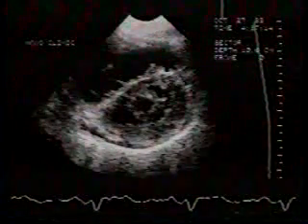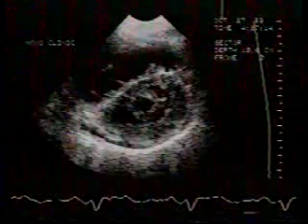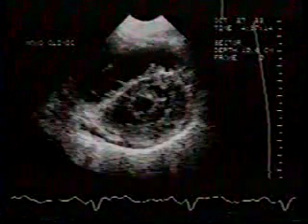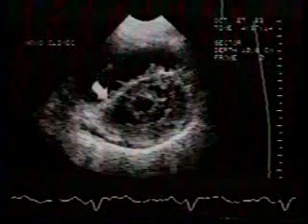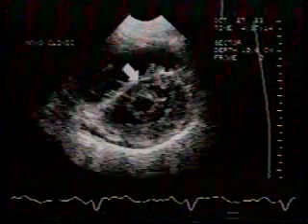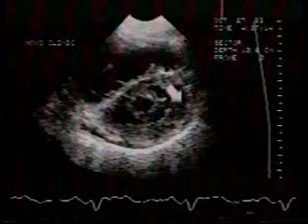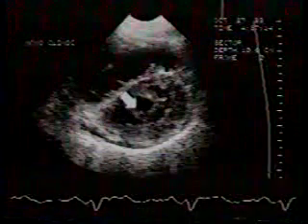This can be directly visualized by 2D echo, as illustrated by this diastolic short-axis still frame from a patient with mitral stenosis. The dilated right ventricle and the flattening of the ventricular septum are indirect signs of pulmonary hypertension. The left ventricle and mitral valve both appear in short axis.